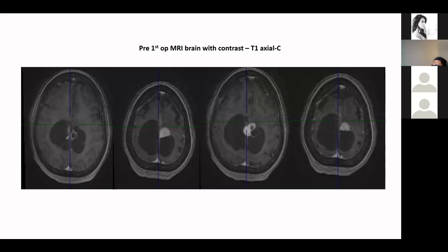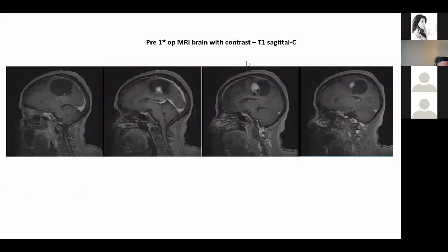So it is basically possibly a dural-based extra-axial midline lesion showing extension bilaterally, displacing the brain parenchyma, and has a cystic cum solid internal texture. And on T1 post-contrast sagittal images, the same features are re-demonstrated. So to me, this is an extra-axial lesion because it is displacing both of the cerebral hemispheres and it is lying along the falx.